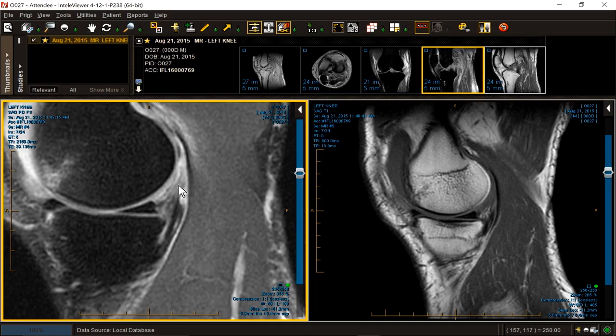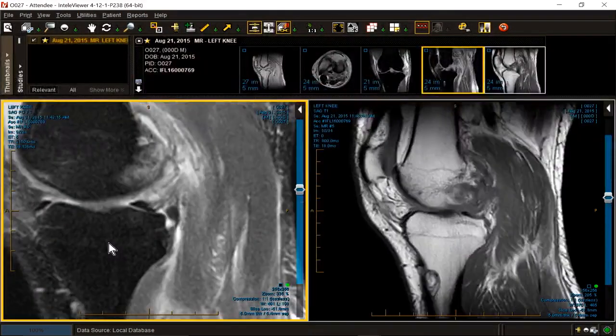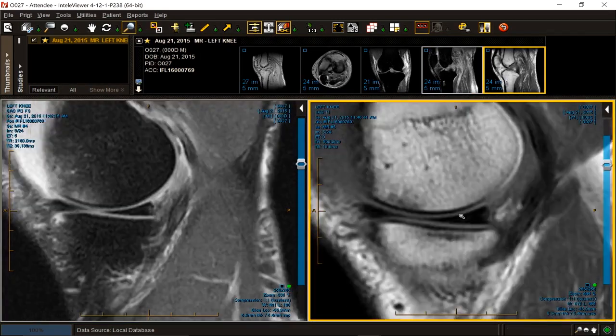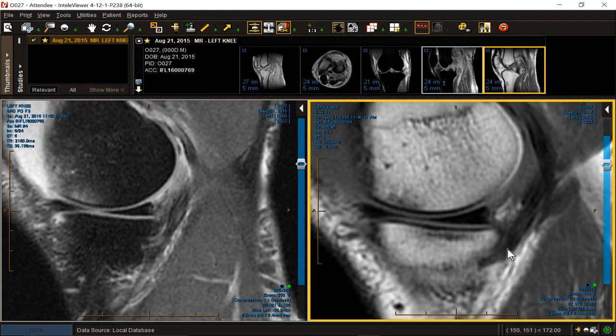A rather extensive conclusion, longer than I usually would give it. But those are all relevant to the management of this patient. I would put the non-ossifying fibroma in the body of the report. Are there any questions about this case? It's a rather dramatic one. Pretty good look at the direct head insertion of the semimembranosus, which is intact. Let's move on.